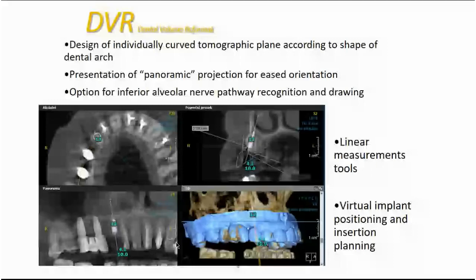It will help us understand our tasks and do the planning. Honestly, the majority of implant planning procedures are done, at least in our country, just by native X-ray pictures.